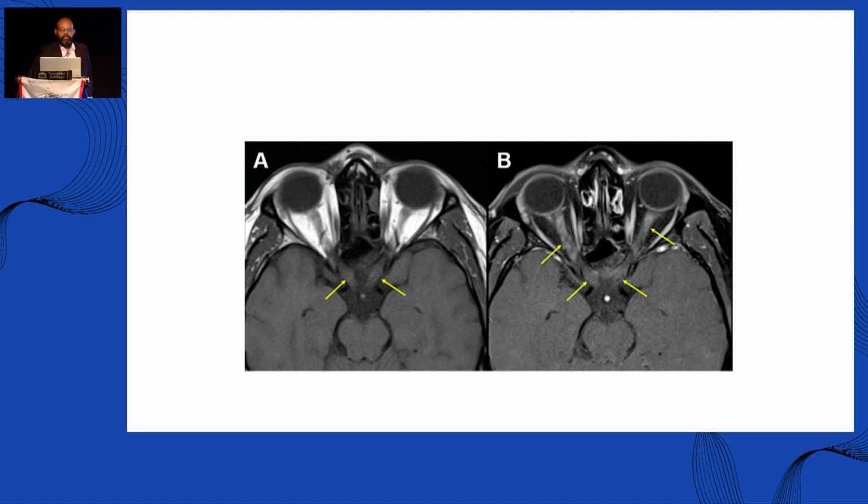This is the MR. You can see the arrows, which are easier now. Okay, so what do you think this particular disorder is? What do you see on MR imaging? So it's bilateral, isn't it? Bilateral involvement. Which part of the optic nerve is mainly involved? Do you see on MR imaging? Which part? Posterior part, exactly, yes. And you can also see it's not only the posterior part, the chiasm is also involved, yes.